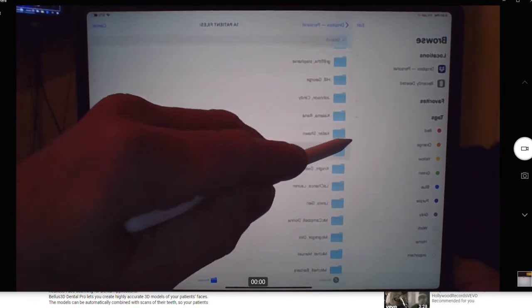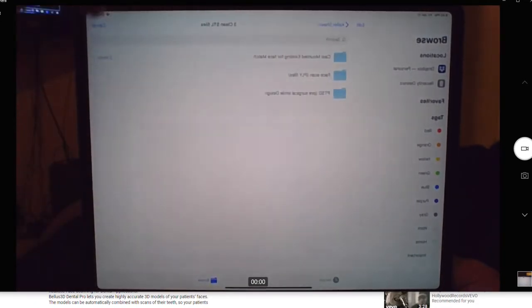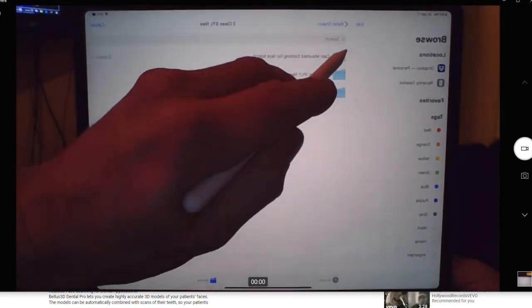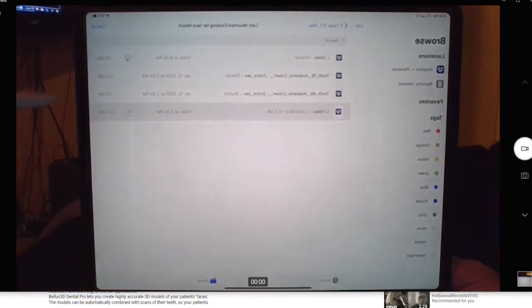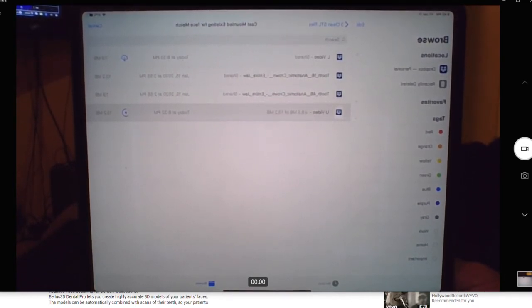Keller Sean. Go to Clean Ones. Don't grab the other one. That'd be a huge mistake. Go to the ones that we cast mounted. That's what we did, so cast mounted. And you just need to bring in the upper video. So bring that one in, and it's downloading right now. I probably didn't even need to save the other one here to confuse myself.